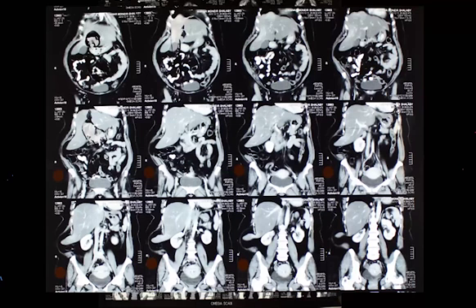A lung contusion: the alveoli fill with fluid, in this case blood. And then you call it a pulmonary contusion. You also talk about brain contusion, pulmonary, myocardial, in everything: liver, spleen, all the solid organs. Muscle contusion too. All of them are contusions. Interstitial bleeding, minor vessels, no hematomas: they are called contusions. Okay. So we have seen all of these things, thank God.